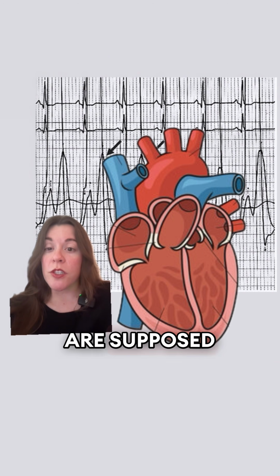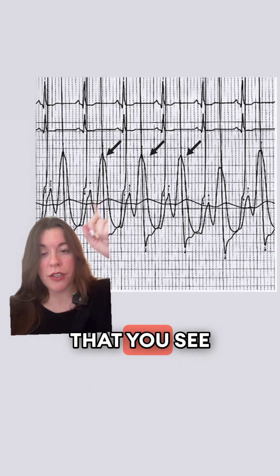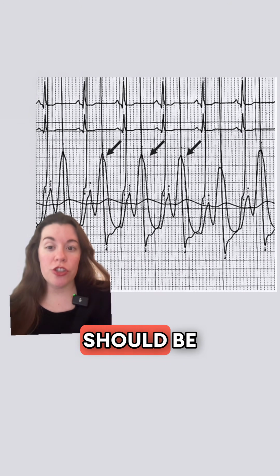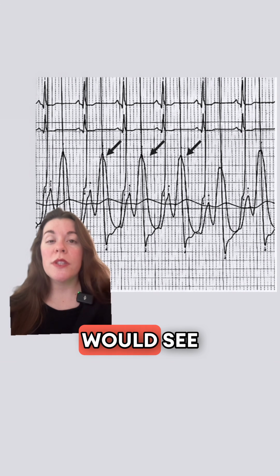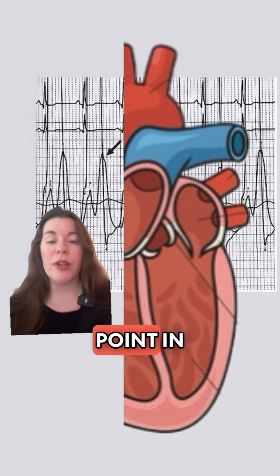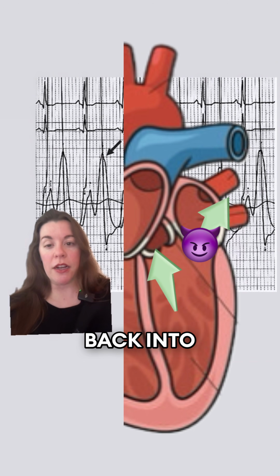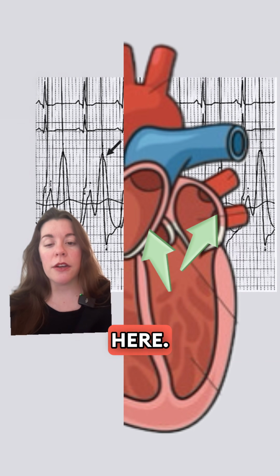Well, the valves are supposed to be closed when that is happening. So that pressure that you see right now should be much lower than that. Nothing really crazy should be going on. But during that time is when you would see regurgitation if the valves are not fully closed during that point in time. And then when a ventricular contraction is going on, blood comes back into the atrium and you're going, wait, hold on a second, this extra pressure shouldn't be here.